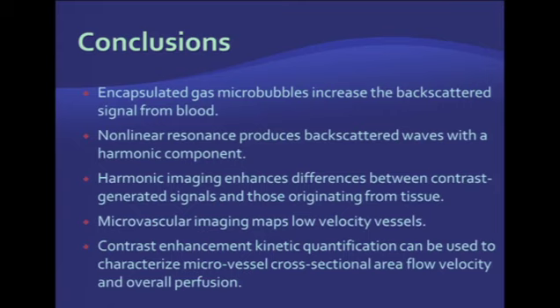Majority of them will employ some kind of time intensity curve plotting and quantifying different parameters. Microvascular imaging is helpful for lesions with slow flow velocity or low levels of vascularity. And finally, contrast-enhanced kinetics can be used to characterize microvessel cross-sectional area, flow velocity, and overall perfusion, which is useful in cancer imaging.